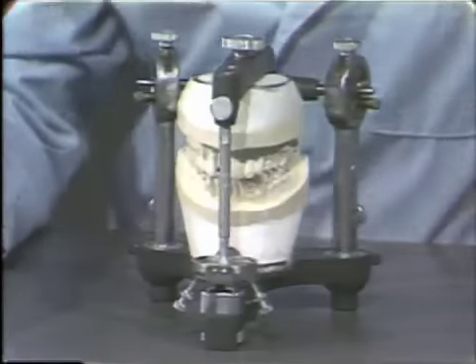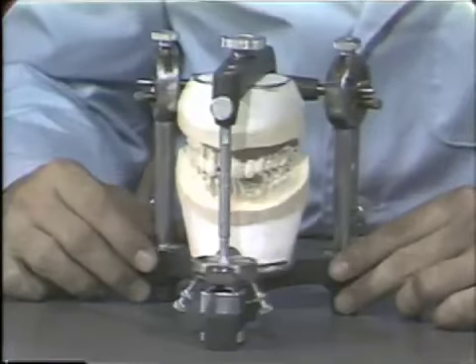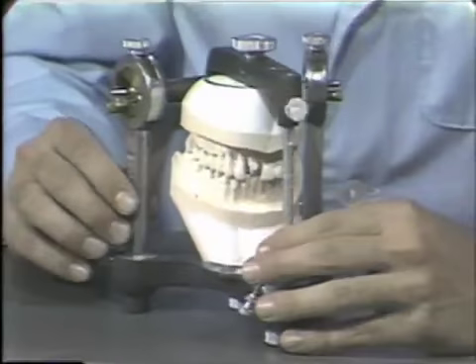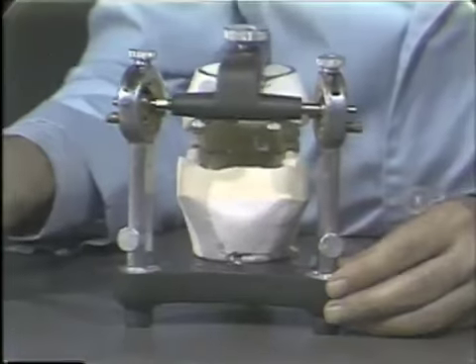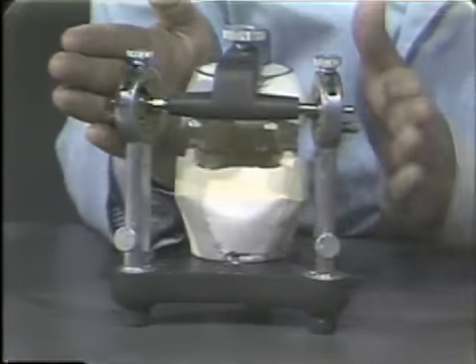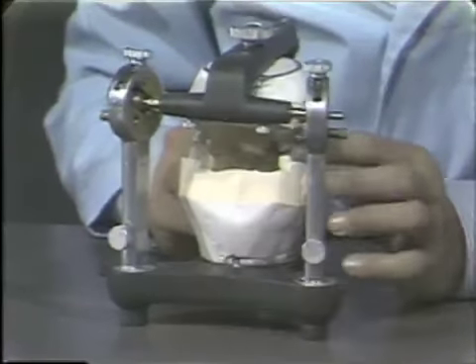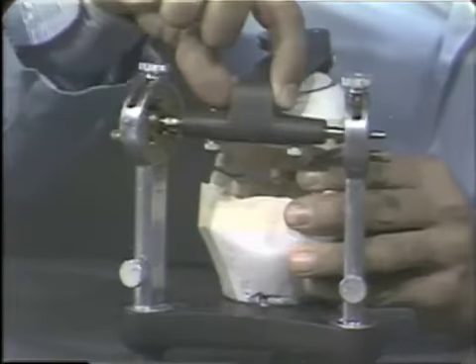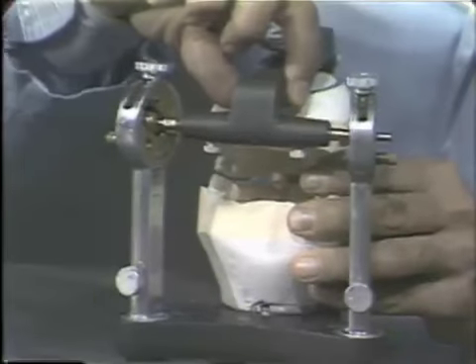Now the articulator, to some degree, compensates for this immediate Bennett shift that we saw can occur in a patient. Now, if we look from the posterior at the articulator, we'll see that the vertical axes are divergent. This means that immediately when the condylar ball leaves the fossa, it's in an area that's a little bit wider in the condylar tracts. This allows a little bit of play in the articulator.